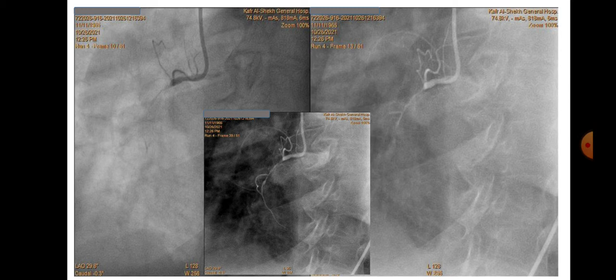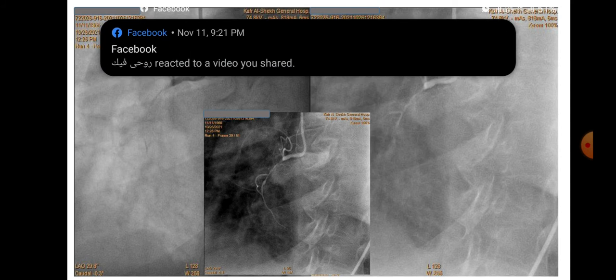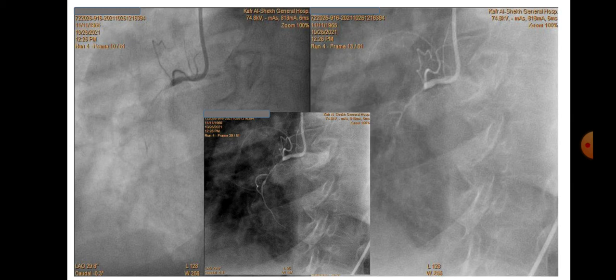These are some illustrations of the speculation about the use of inverted grayscale for better visualization of ambiguous coronary artery lesions. This is a case of proximal total RCA occlusion with a functional track and a little bit of retrograde filling from the left system.